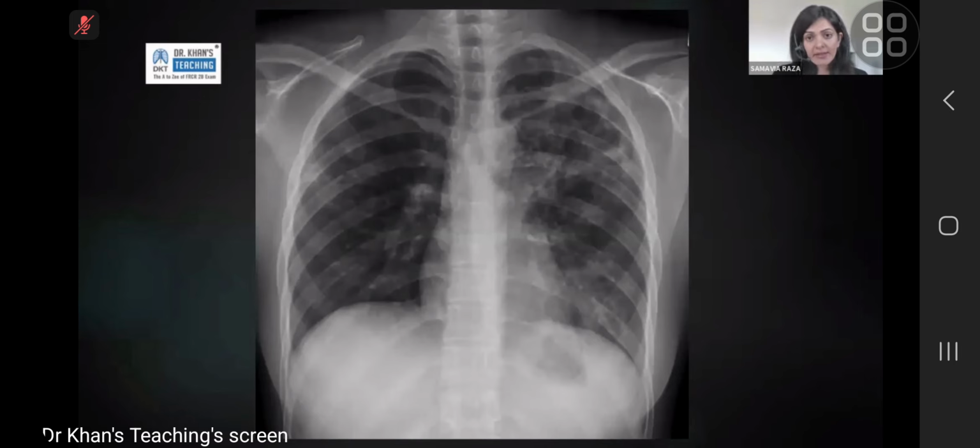This chest X-ray is a young patient with bilateral changes. They are asymmetrical changes. There is no clear zonal distribution. You can see some areas that look like they may be cavitating. Then there are some areas that look like a fluffy nodularity, a few tending towards consolidation towards the base. So if in a young patient you were thinking about typical infection or lobar pneumonia, this wouldn't really fit because the changes are bilateral.